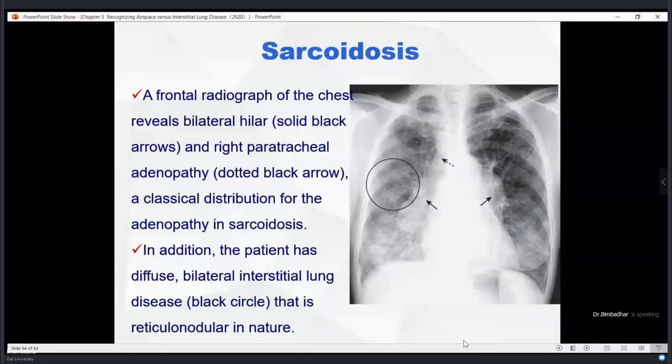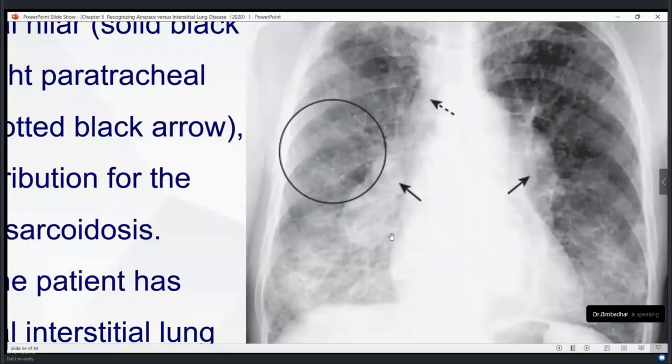So what we see here, if you can look closely enough, is the pulmonary artery, and along the pulmonary artery you see some other well demarcated oval density. It may not be visible, but that is how I am imagining and thinking about the disease. This is the area of the pulmonary artery, with the bronchus intermedius going along with it. And you see there is a white, well demarcated, round oval density of greater than 1.5 centimeters.